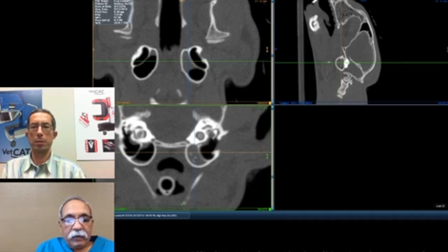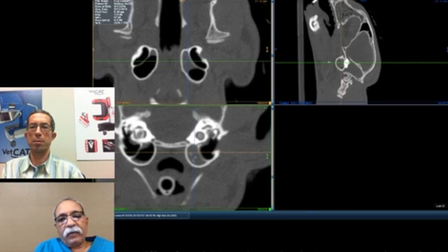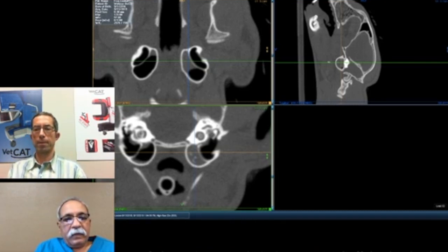Some cholesteatoma is going to be very aggressive, some is not. Some you do 1 surgery, some you do 10 surgeries. So it all depends on how the dog is responding, and that determines how frequently I want to look. Now, when you are treating ear conditions and ear diseases, it's a marriage between CT and endoscope. So you have to put both information together and decide how often you will need to do the CT.